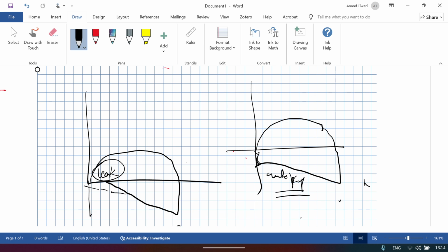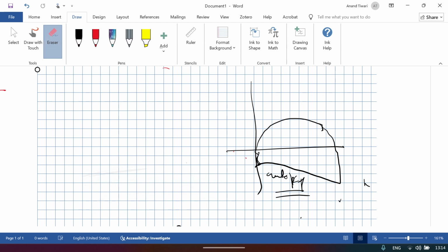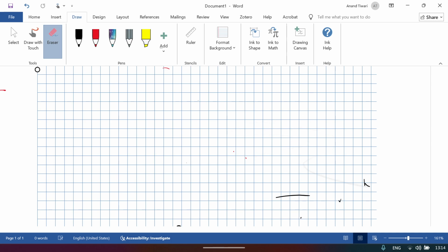So this is how the graphics on the ventilator work. When you are taking rounds, always look at the common curves: pressure-time, pressure-volume, flow-volume, and flow-time. That will give a lot of information and help you troubleshoot and understand the various ventilator-associated problems.